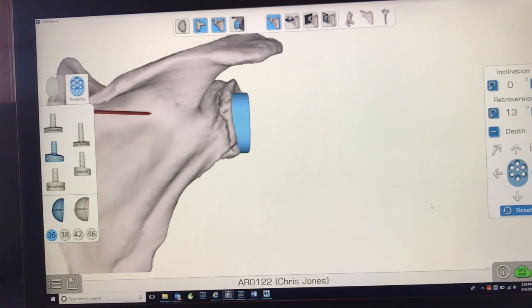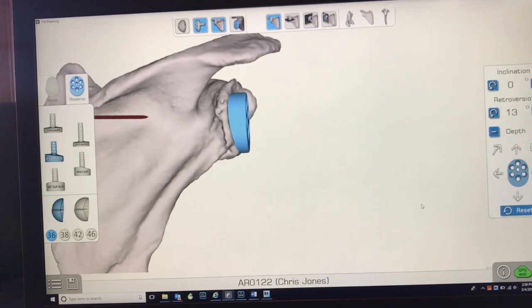But then even more exciting, what Exactech has kind of taken to the next level, is you can take this plan and, in and of itself, it's extremely valuable. Being able to use this to plan pre-op, because if you look at enough of these and you set your plan pre-op and you get in there, you can pretty much nail it if you do a lot of them.